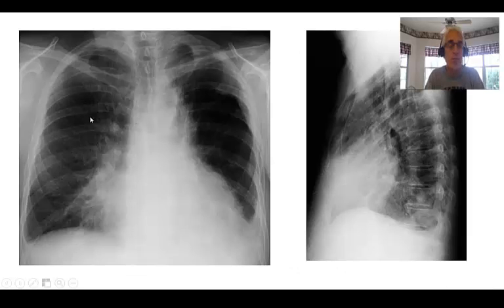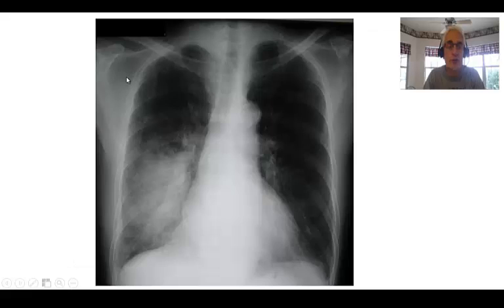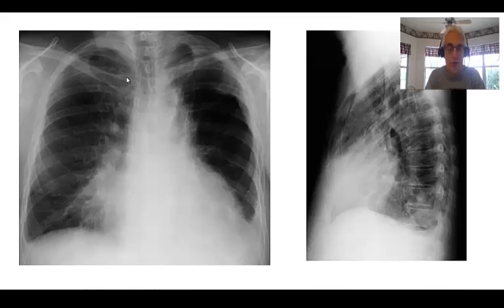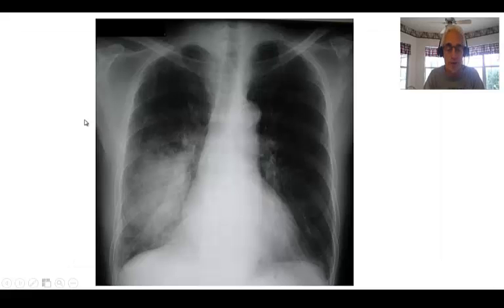Now here's a 40-year-old alcoholic who presents with a seizure to the emergency department and now has fever. You notice now his airway is a little curved, but the reason is, look at the bones. He is turned or tilted to the right. And the reason for that is he's not terribly cooperative. So he is turned to the right side, on his right side somewhat. And so it gives you a little asymmetry between the left underexposed side and the right overexposed side of the lung. So we realize that's there.